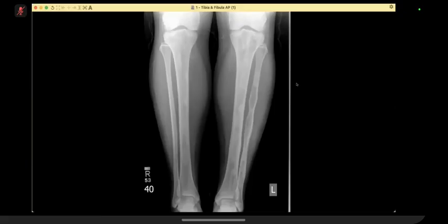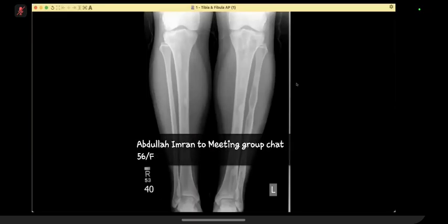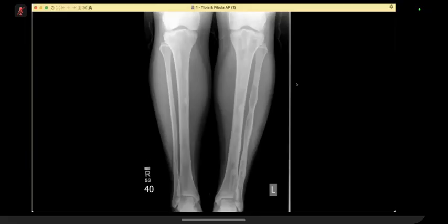I can see also here the radiolucent area may be reaching the subarticular surface, that may give me a non-classical appearance, but may give me an impression of a blade of grass appearance. The same findings, but less evident, I can see on the right side. I'm checking now if there is any pathological fracture, which I'm not able to see.